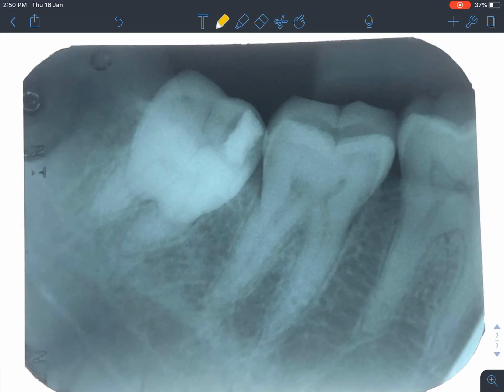Where? Can you point out again? Can you draw the line and show us? Yes, that's why we feel that it is partly, I mean, not completely erupted. Okay, part of it must be still inside, the entire crown is not completely out into the oral cavity. Okay. Next, is there anything else that is obstructing the path of eruption? 4-7. How? Contact. Yes, correct.